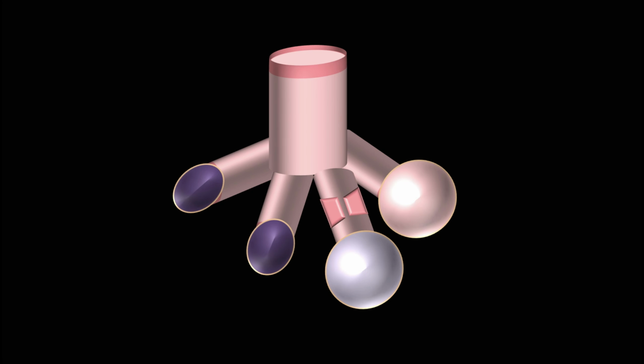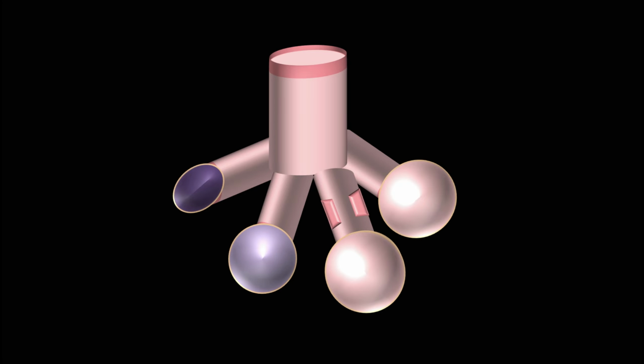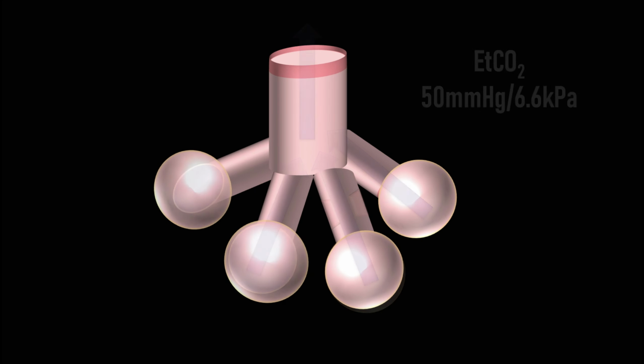With a couple more breaths, these lung units start to inflate better, so the end tidal CO2 increases, but much of the lung is still trapped behind closed airways and atelectasis. As ventilation progresses, closed airways are opened up as airway pressures equalize across the lungs and ventilation increases. Ultimately, all the ventilation perfusion problems resolve and the lungs ventilate well.